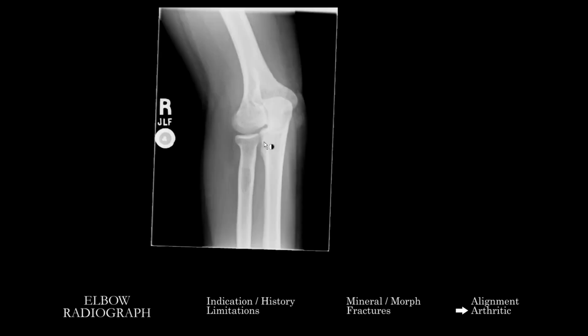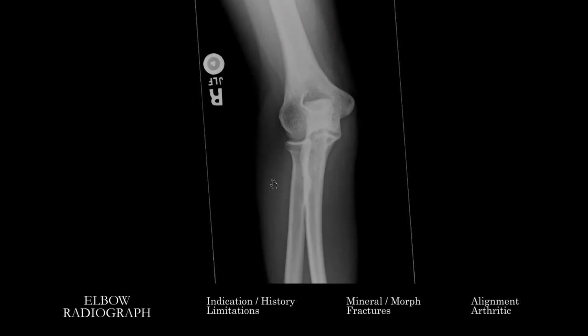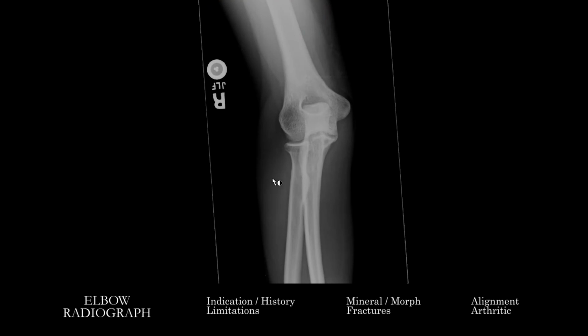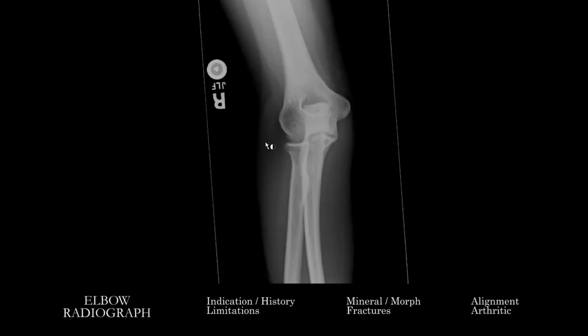In less common circumstances, you might see erosions, you might see other inflammatory or arthritic processes as well. It can be important to remember, at least as part of your checklist, and this may be more so in younger populations, that you can, in some circumstances, see osteochondral lesions at the capitellum, which would be a common place to see them when they are here.